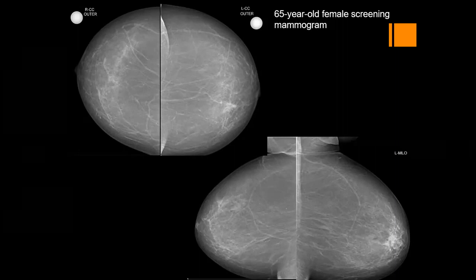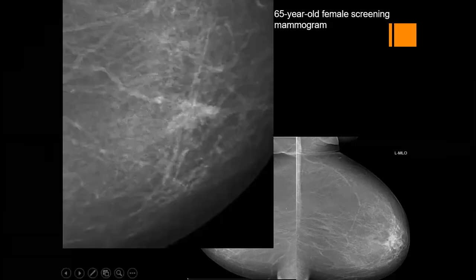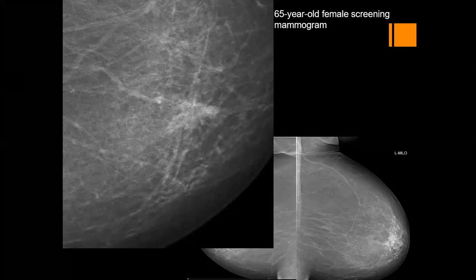Yes, there is distortion. I agree with you, there is distortion. But I'll show you. Now you can see it closely. Is it a mass? Here, does it look like a mass? Look at the center, it is centrally hypoechoic, not like the periphery. Could you see any convexity? I think it is architectural distortion. Yes, there is asymmetry with architectural distortion.